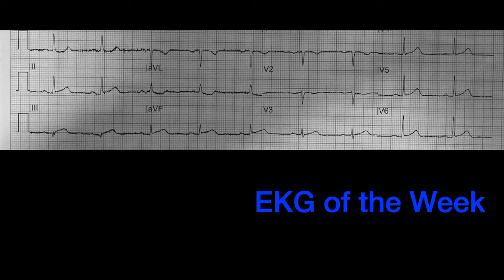Hey there, EKG of the week number 2. This is a two-parter actually, so we're going to start with a transmission that was made to the hospital. We'll start with the pre-hospital EKG, and then we'll get to the hospital EKG itself, just again for practice.